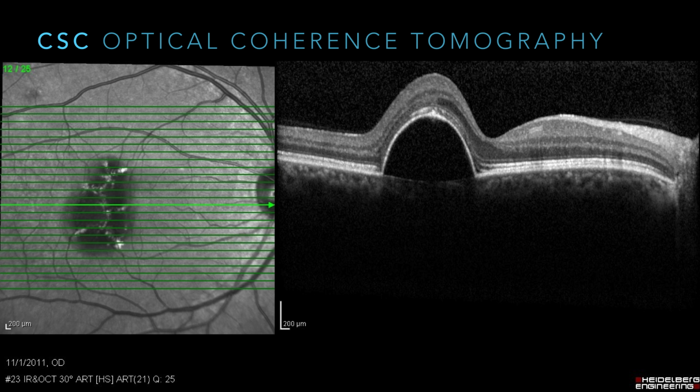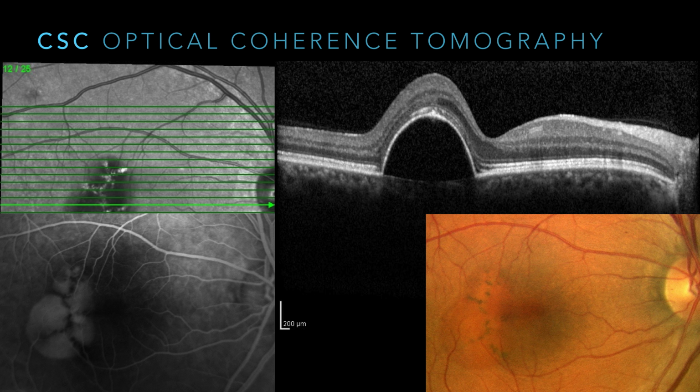So this is a patient that actually may not have central serous. This is a large PED, asymptomatic patient, monitored for a few years, hasn't changed in size since I've started seeing her. You can see the hot cross bun sign on the fluorescein angiogram. You see the RPE changes on the color fundus photo.